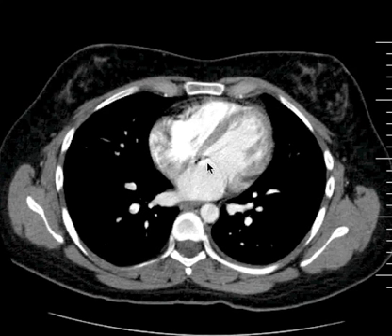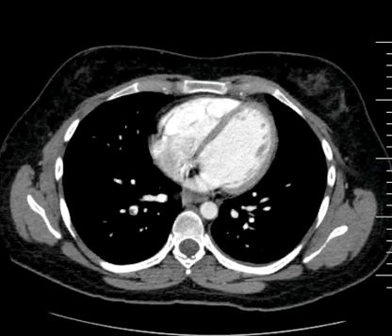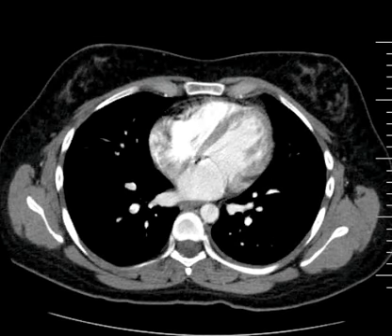And these are the valve leaflets of the mitral valve, which you can make out a little bit in that area in this case. Once in a while you can actually see nicely the chorda tendineae emanating, you get a hint of them here, emanating from the papillary muscle and radiating up to attach to the margins of the mitral valve leaflets.